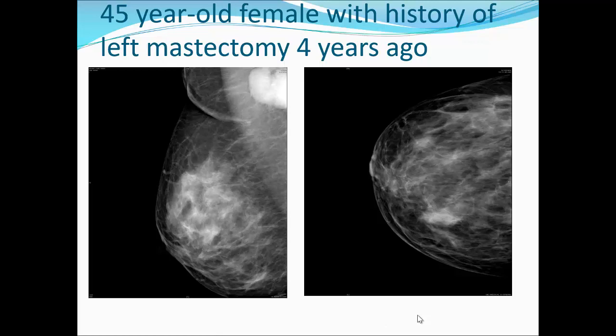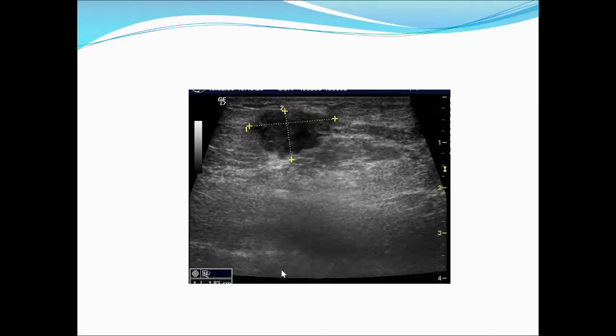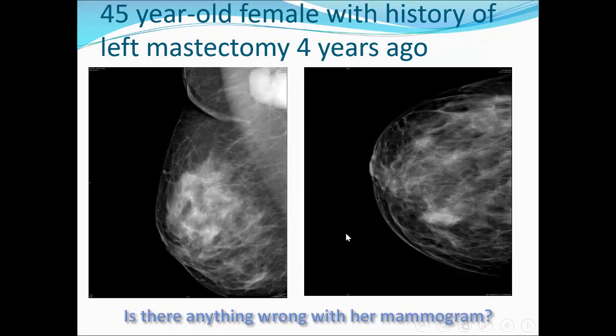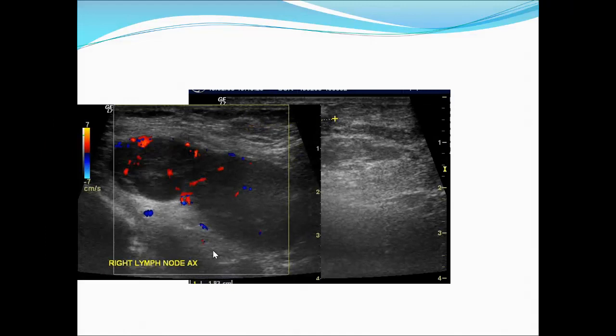This is again an axillary node looking malignant. In a patient doing mastectomy, we must know if it is metastatic or there is another malignant lesion in the same breast. From the mammogram, I think here there is focal asymmetry in that area. And on ultrasound, there is another malignant mass in the other breast. And malignant axillary node that we see on mammogram.